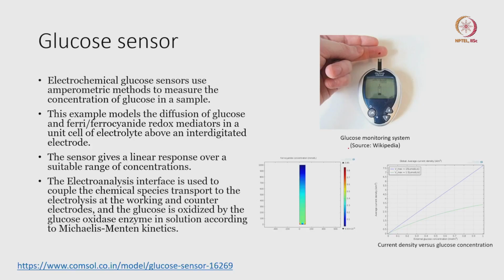And then we have glucose sensors. So for people who are from a chemistry background, such electrochemical glucose sensors could also be simulated. These are the electroanalytical simulations that you need to perform over here. And it's not just limited to the glucose sensor in the fingers, but you can also perform a similar kind of analysis in the brain on a similar line.